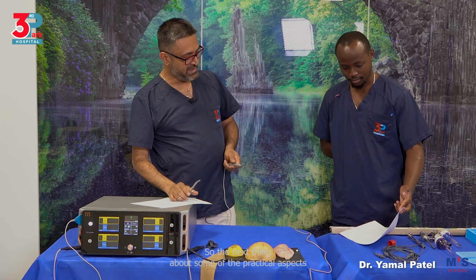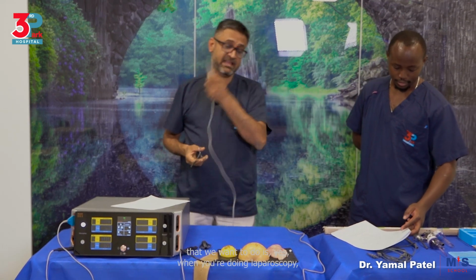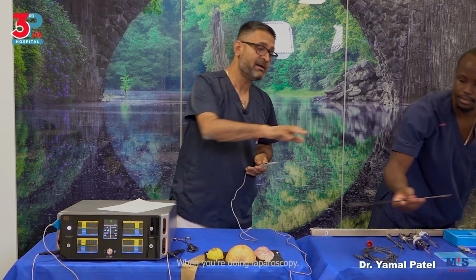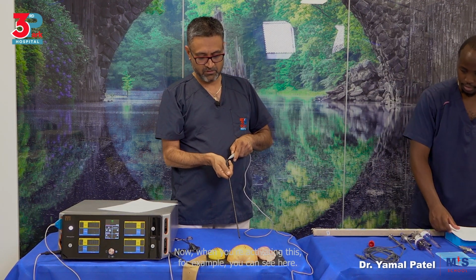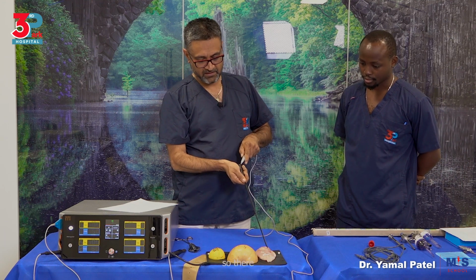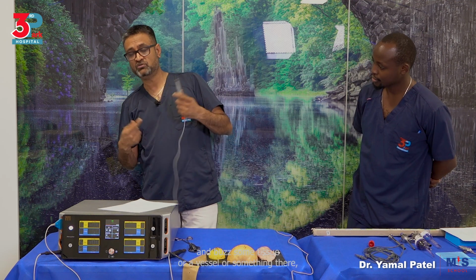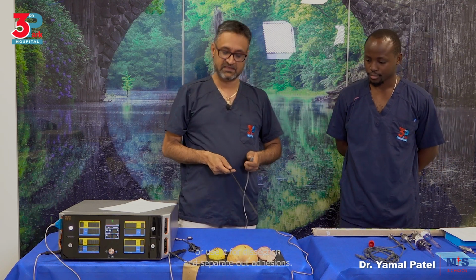Okay, so the next thing about some of the practical aspects that we want to do is, yes, when you're doing laparoscopy, give me the laparoscopy instrument, the long one. When you're doing laparoscopy now, when you're activating this, for example, you can see here, okay? So that's laparoscopy, where you want to go and buzz some tissue or a vessel or something there, or use it for dissection and separate out adhesions.